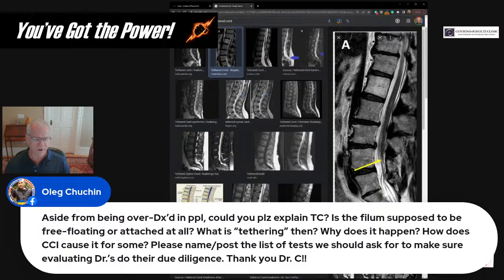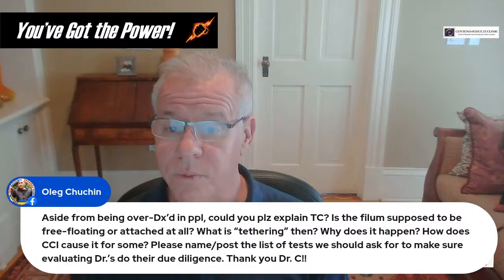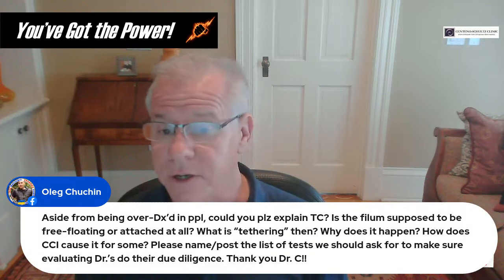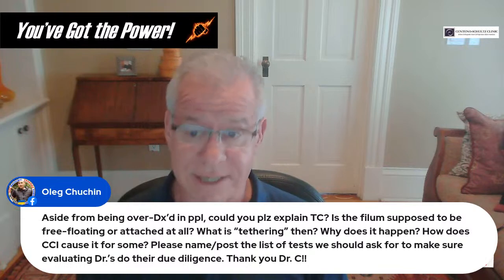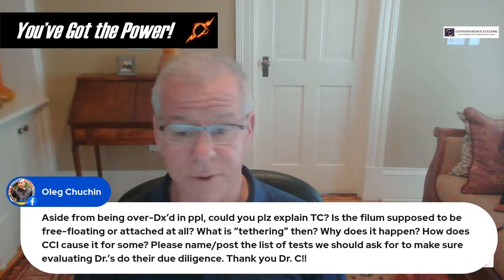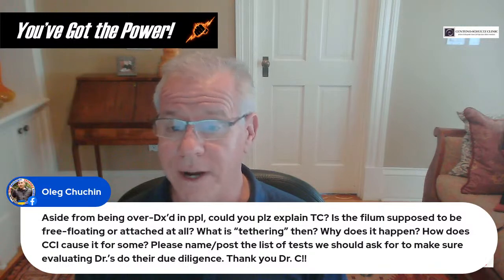Occult tethered cord is very, very different. Again, just to compare, normally the spinal cord stops way up here, and in a tethered cord it's pulled way down. Occult tethered cord, or OTC, is pretty controversial in the neurosurgical community. If we asked 1,000 neurosurgeons whether they believe occult tethered cord exists, we would probably get answers from 999 of them that they don't think it exists. So that's the first issue. Then we get into what it is.